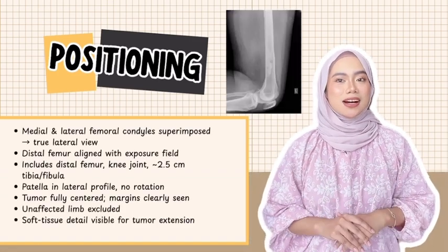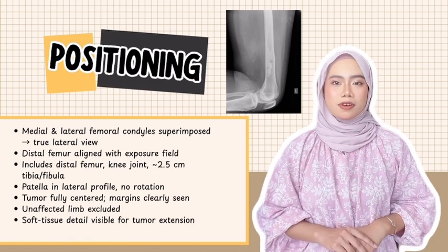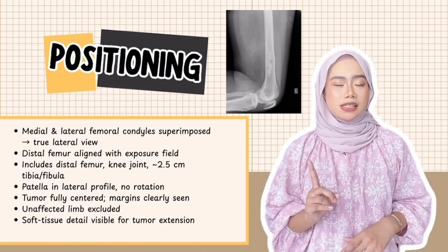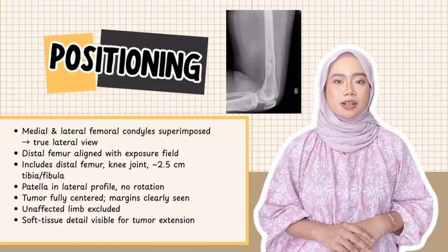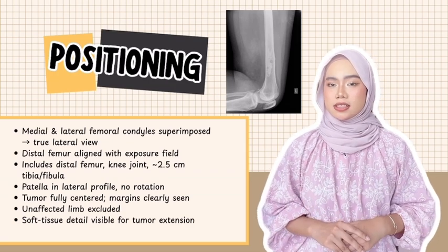Hi, so today I will be talking about PACEMAN for lateral distal femur tumor. For the positioning, I can say the positioning is correct because firstly, the anterior and posterior margins of the medial and lateral femoral condyles are superimposed, demonstrating a true lateral projection.